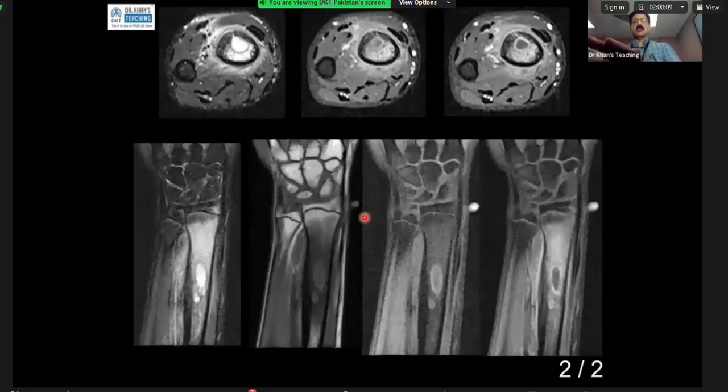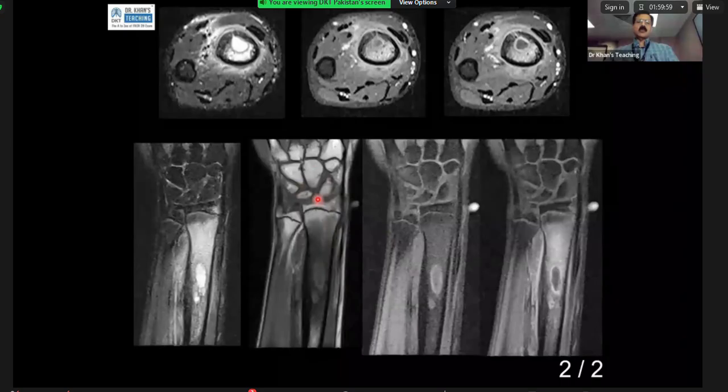So this is the case which we did see initially when I was showing you MR of MSK. Here, this is a T1 weighted sequence. This is a STIR sequence. This is a T1 fat saturated, T1 post contrast fat saturated. This is pre, this is post. So you can see the penumbra sign. Actually, this is one abscess and there is a satellite abscess here also, Brodie's abscess. A lot of edema, which is low on T1, high on the STIR sequence. And it shows enhancement, intraosseous abscess.